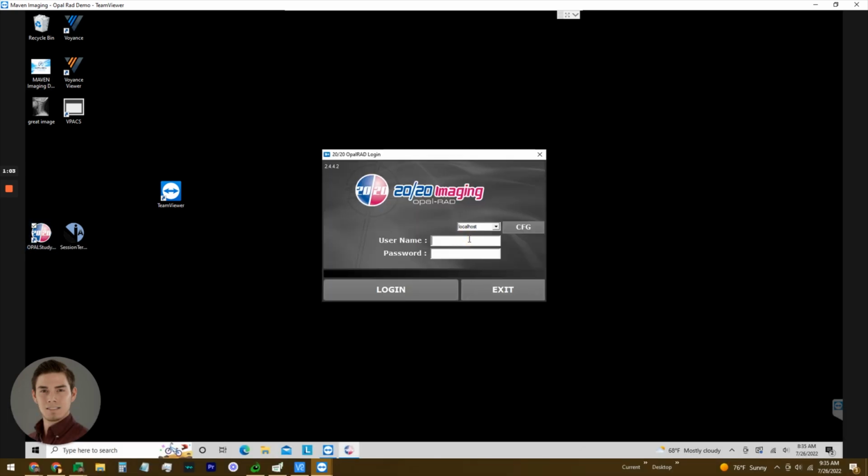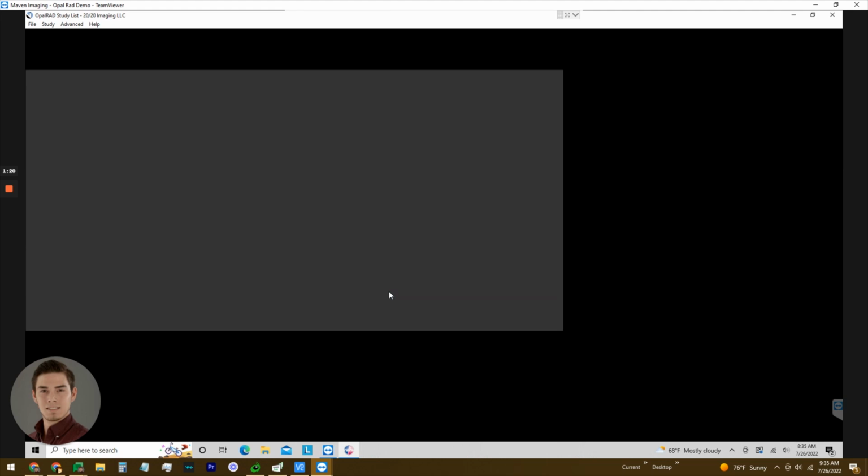You're going to put in your username and your password. This is going to be sent to you, or it'll be in the documentation that comes along with the software. Default a lot of times is site admin, and then the password is 1 through 9.